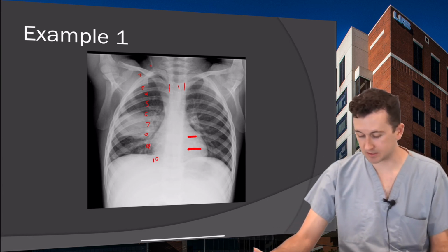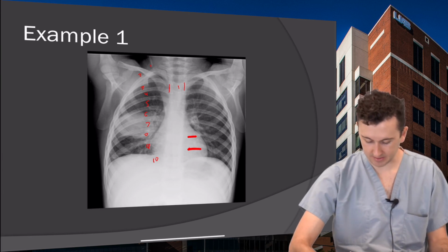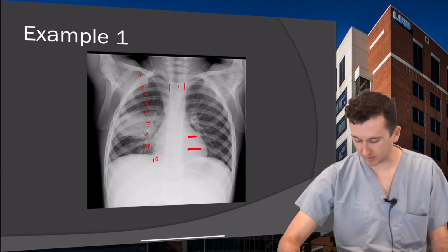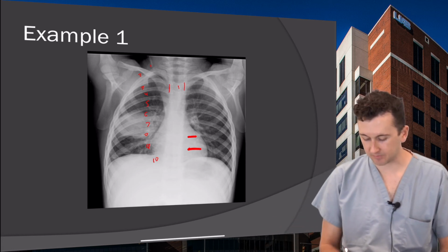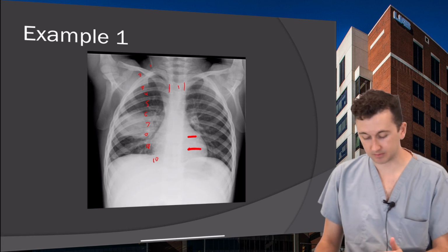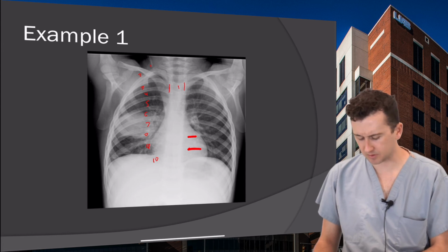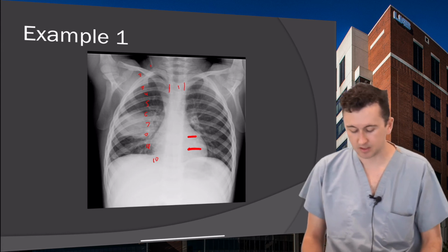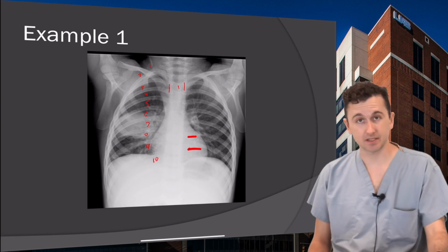You can see the heads of the humeri. Those look okay. Now you know it's a kid because he's got pretty significant growth plates at the heads of his humerus there. And as I mentioned, his clavicles haven't squared off yet, so those are kind of dead giveaways. But look at your humerus, look at your scapula. Glance through your ribs. The ribs look okay, so I'm not seeing any major abnormality in terms of bones here.